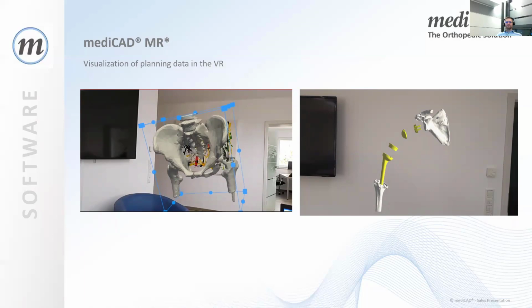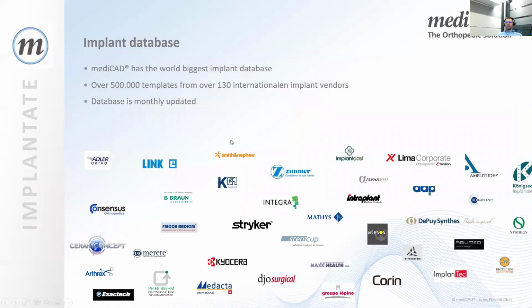Just a few sentences about our database, because that's a very big part of our software and of our company. We have a very huge implant database so that you can plan with the implants you are actually using. We have 500,000 templates at the moment, and the database becomes bigger and bigger.